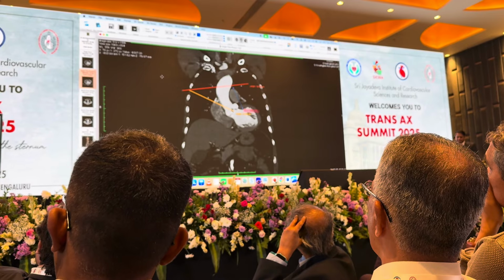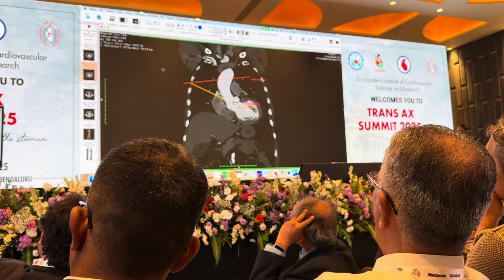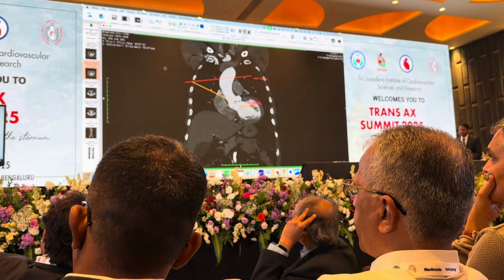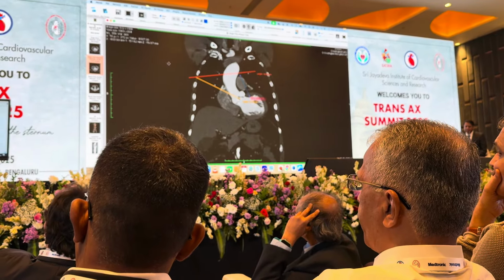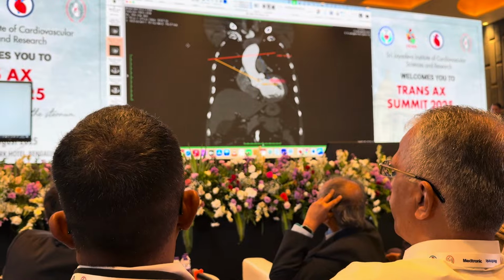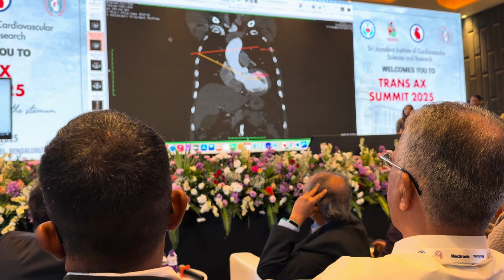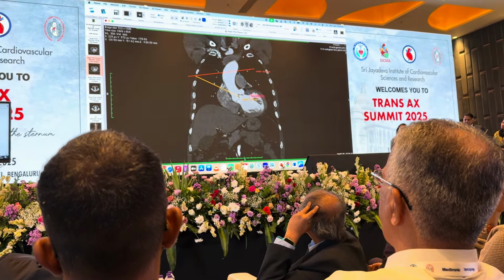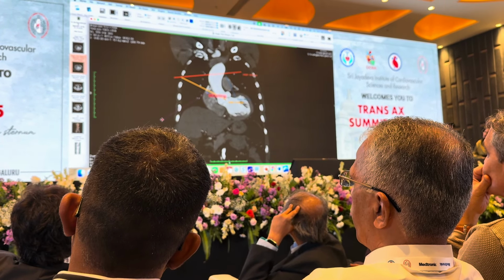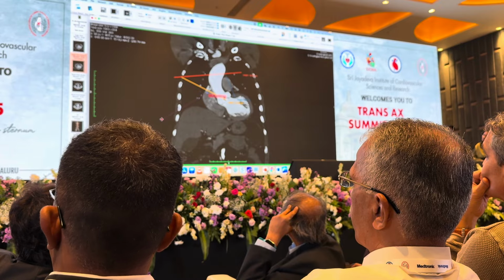With transaxillary mitral, you work endoscopic, it was like this. You work towards the left upper shoulder. Transaxillary, you work perpendicular or a little bit oriented towards the LV apex. And here you see if you will be comfortable on table or not, because this will be your working trajectory. Your clamp will be off the line, but you see you will find the right atrium here. So normally when we're doing aortic valves, we put the stay suture here, and that goes out of the chest to expose the non-coronary sinus.